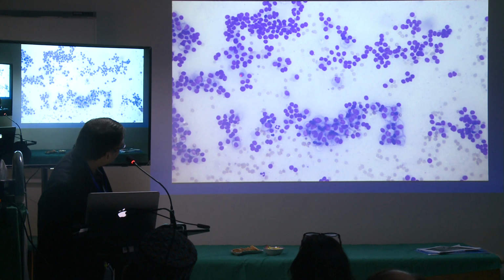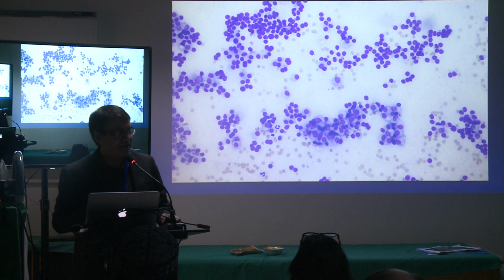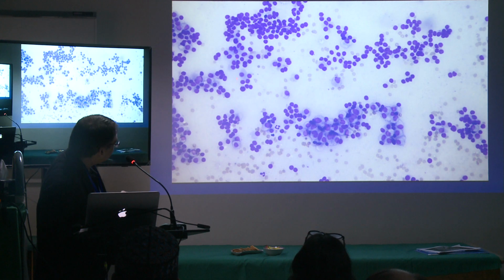So this is a regular nucleus. Do you see the cytoplasm around that? Reminds you of something you might eat at breakfast? Fried egg. Right, okay. So right there, you see that here. You see it in other places as well.